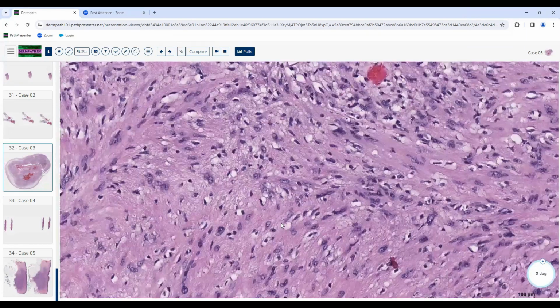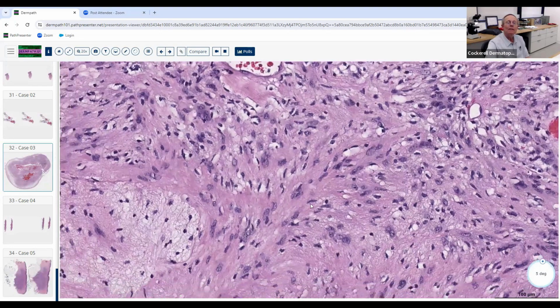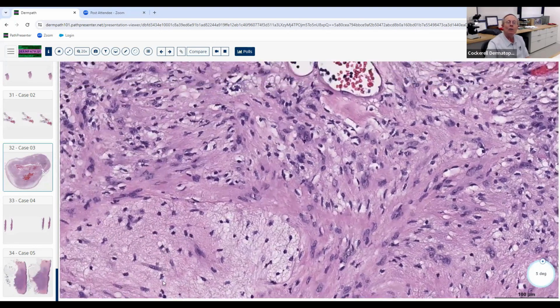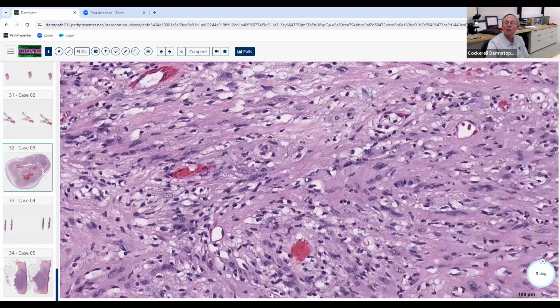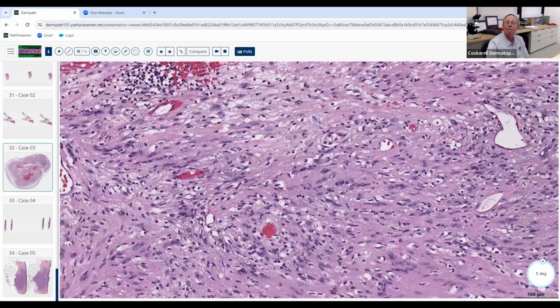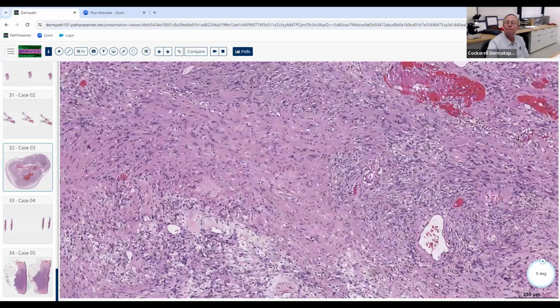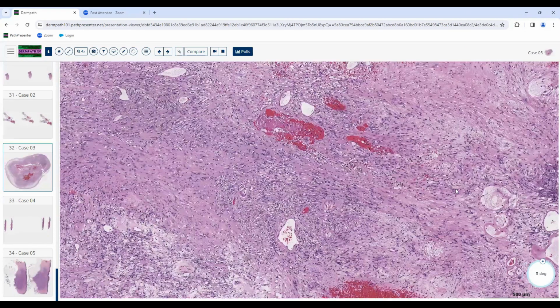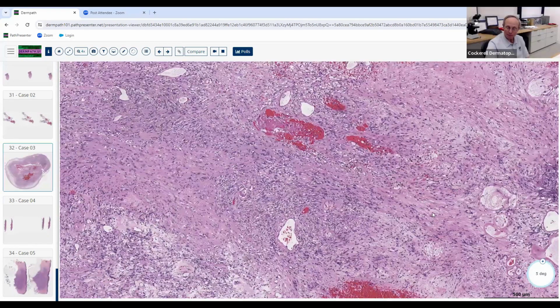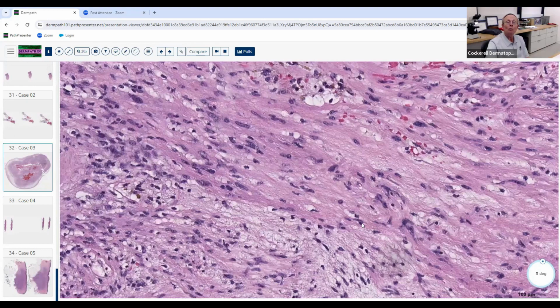Non-epithelial. Good. Absolutely non-epithelial. Excellent. Any ideas? So we're not epithelial. What are our three main ones we instantly think about right off the bat? Like fibrohistiocytic. Good. Or neural. Good. Or muscle. Good. Excellent. So given that those are our three most common ones, do you think it's any one of those three?